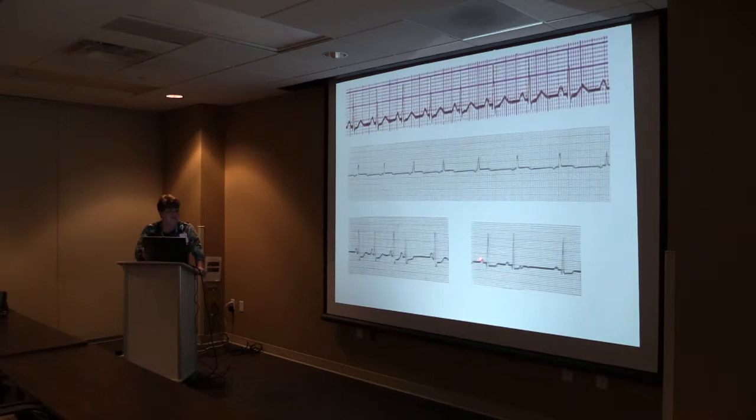Let's look at this one. Positive P, QRS, positive P, QRS. Then what happened right here? The rhythm's not regular. What's this? Here's the norm. What is this right here? If I laid this right on top of this line, it would go straight across, and that little blip right there would be a positive P wave. But what happened? It didn't cause a QRS. This would be a non-conducted PAC. Still a PAC, but it's non-conducted. So this would be a P wave, and it would be a positive P wave. So you've got to look at your strip very, very closely.